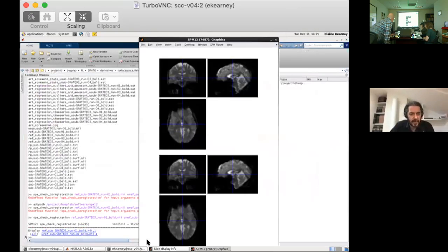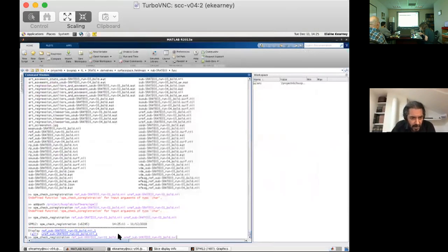Could you also, in the same line, just show another image, also show the field map, just to make sure that we have it in the proper space. So do the same thing and then add the one that is called VDM, yeah, for the same subject one.